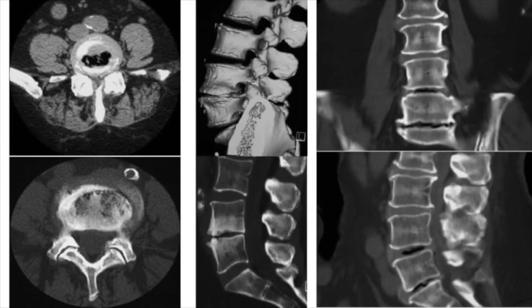So this is another sample. This is a CT scan. You can see the disc spaces reduced and the degenerative changes of the lumbosacral spine. That's more evident in this case. Remember, pause the video, do more research, and come back to the video.